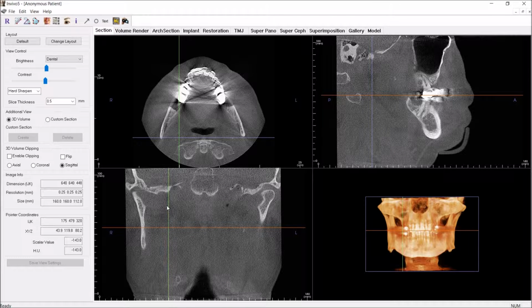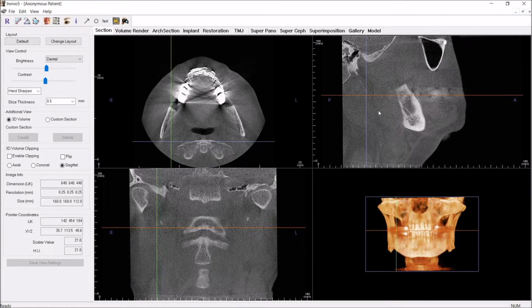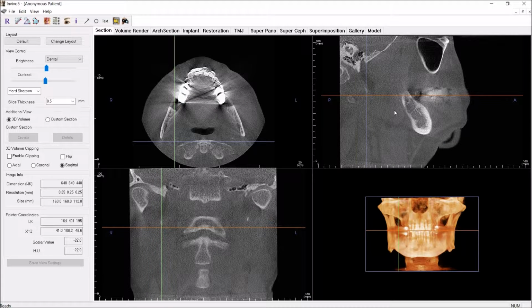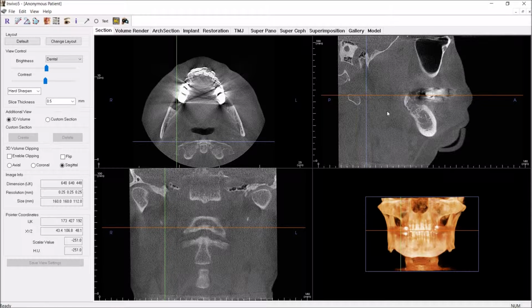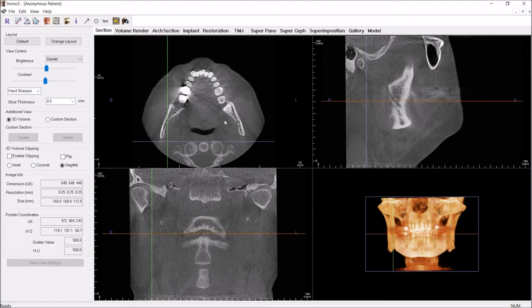Even people that have really thick, kind of egregious looking calcifications, they don't have any symptoms, and I'm not going to diagnose Eagle syndrome from it. So only if there's symptoms, turning their head, they get lightheaded, some people pass out, then they might have Eagle syndrome, but again, I've never seen it. And I've seen plenty of calcifications.